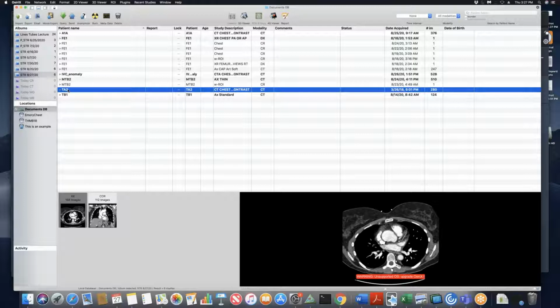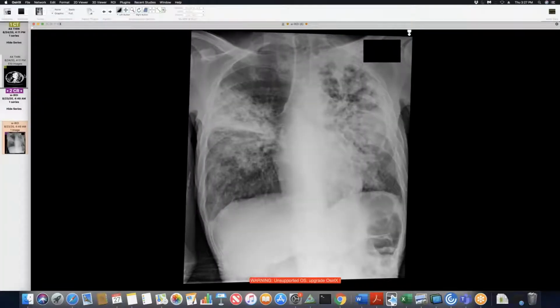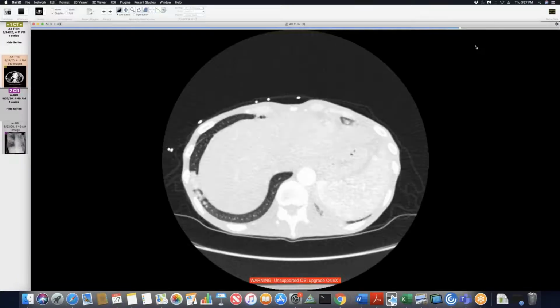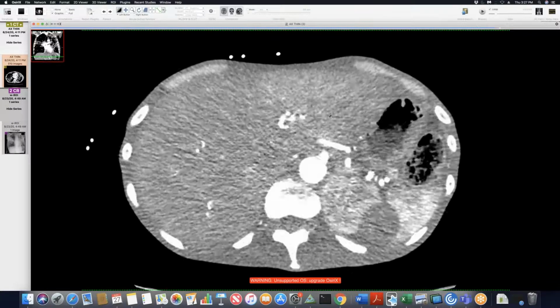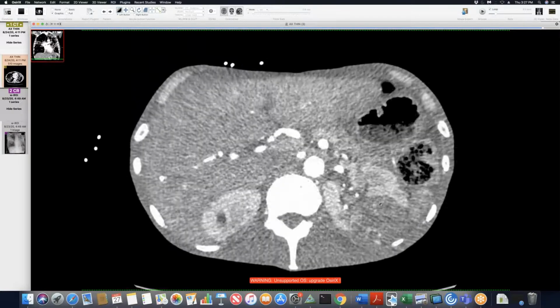And Peter, you said this patient had some symptoms for a while. Yeah, I didn't actually show everything on him, but I showed the relevant stuff. He's had symptoms for a while, and he also has RCC. But then I looked at his chart, and he's a drug abuser also. There's his RCC.